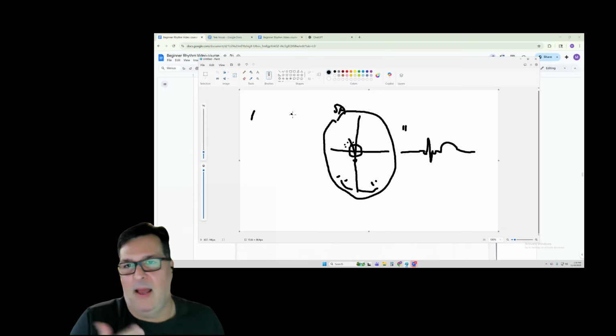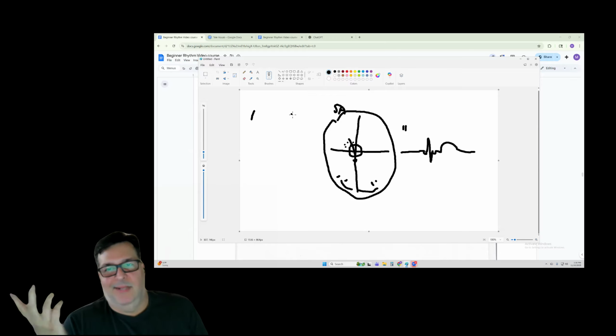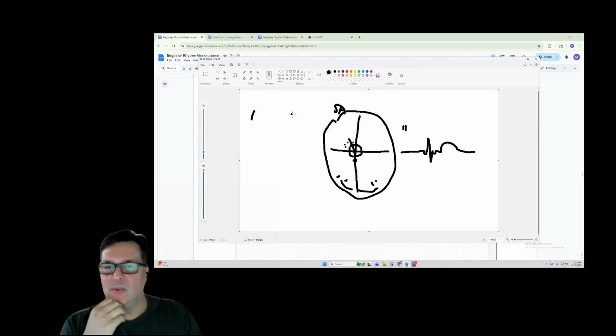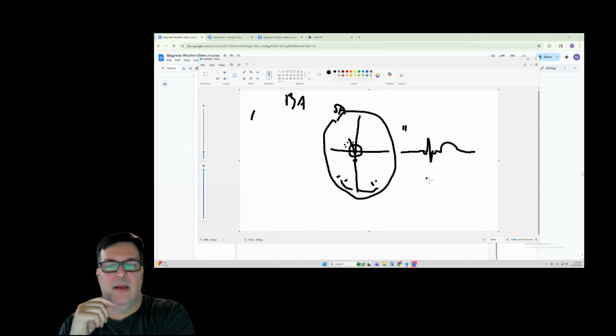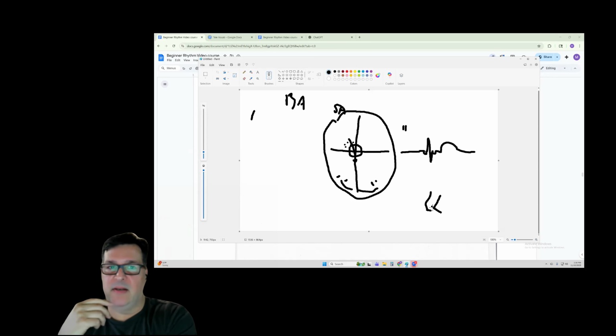And it's a conversation all the time. Like, oh, it's a negative P wave, right? Well, no, it's like 0.16. You can't call that junctional, right? It has to be less than 0.12. So you can consider maybe lead placement, because if these leads are swapped, oh my God, it's awful. If these leads are swapped, it's going to be different, right? It's going to have a negative P wave because it's still traveling in this direction, but the positive is now up here.